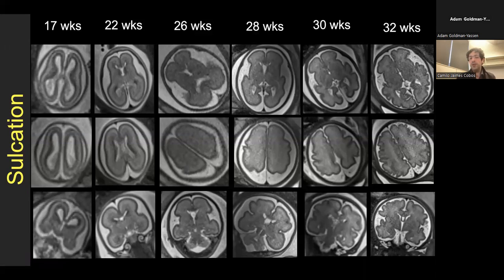And it is really important to also appreciate that a certain degree of asymmetry in the emergence of these sulci is perfectly normal, and one shouldn't be too alarmed. Many of them actually progress slightly faster on the right side. So some asymmetries are known to occur and favor the early appearance of some of these sulci on the right side. But other than gaining that central sulcus around 25 weeks, really not many other sulci have developed.